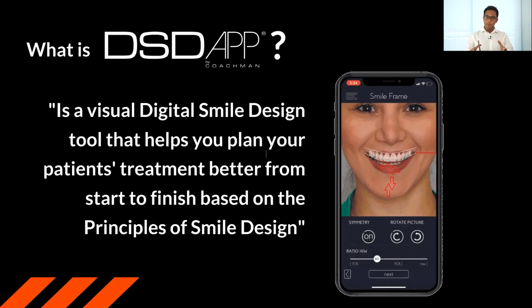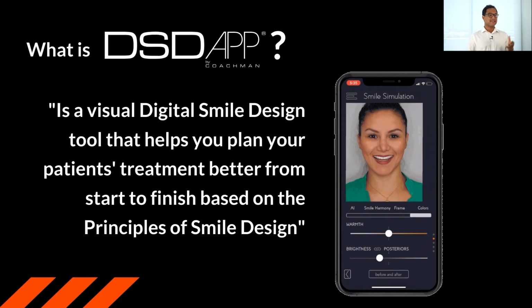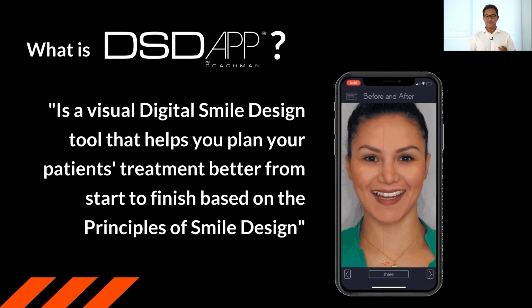To help you better understand, DSDApp is a visual digital smile design tool that helps you plan your patient's treatment better from start to finish, based on the principles of smile design.